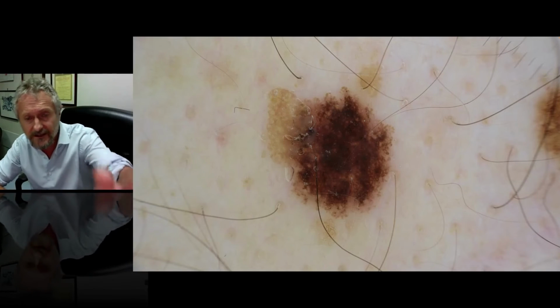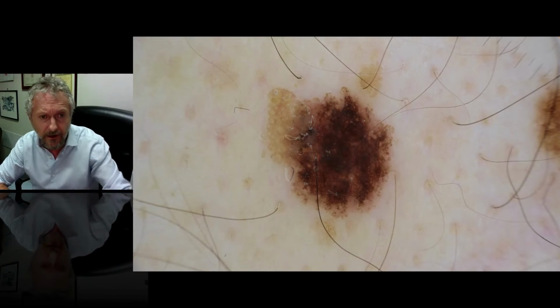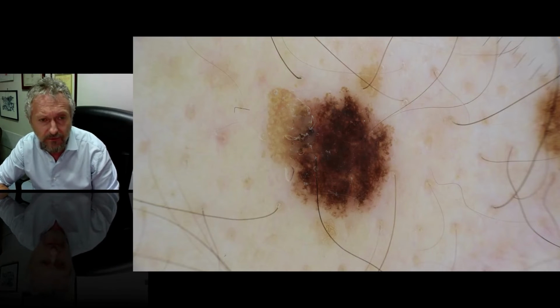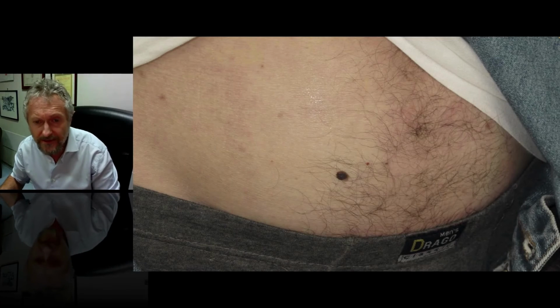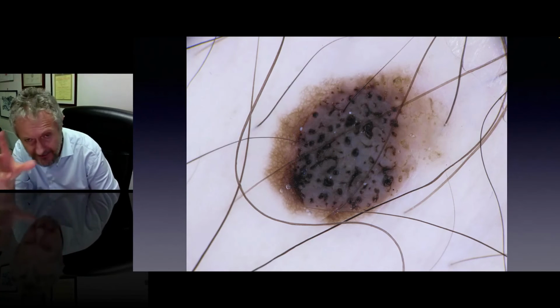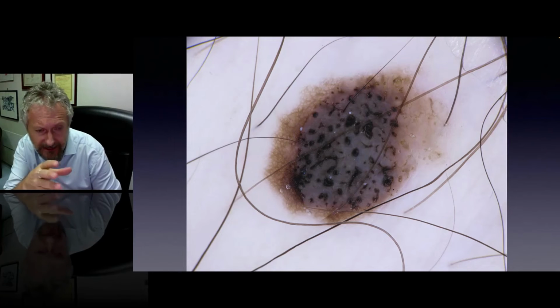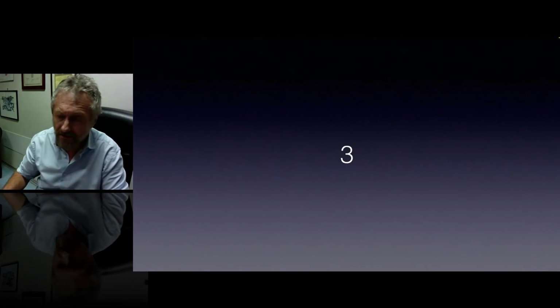Here we see another example. As you can see here, there is a larger area of a reticular nevus, and on the left side, on top, we see a spot of a seborrheic keratosis with multiple milia and comedo-like openings. Another example here, by the way, this is a very suspicious lesion from a clinical point of view, but dermoscopically you can see these beautiful multiple comedo-like openings, and on the left side just a rim of a reticular network. So again, reticular nevus combined with a seborrheic keratosis.